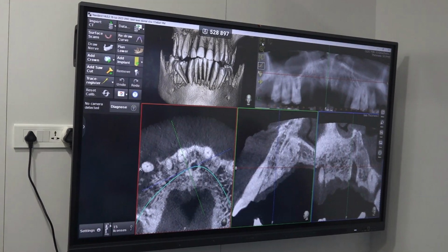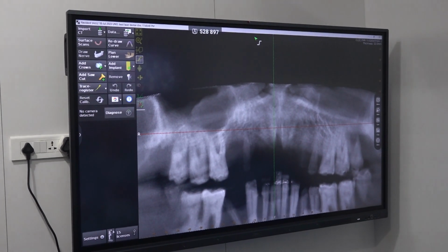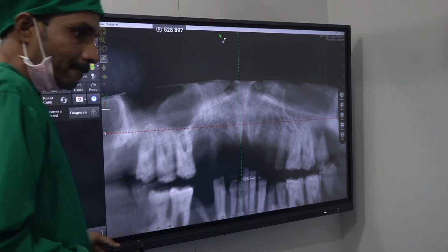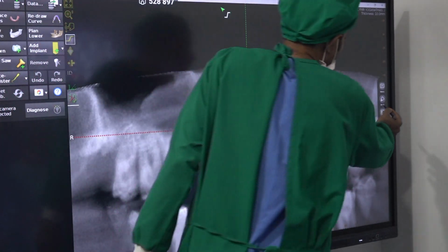It looks somewhat good, right? So first, immediately see the sinus, how much it has gone, front, down, back. Break the image into 3 circles. Of course, here matching teeth are present because of the panoramic section it has got.